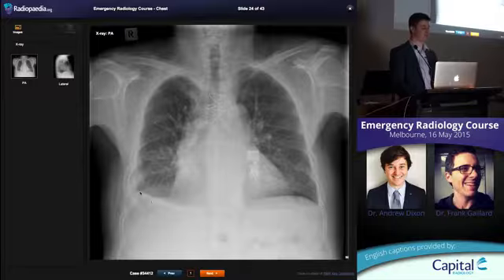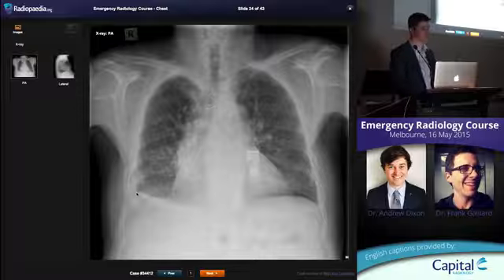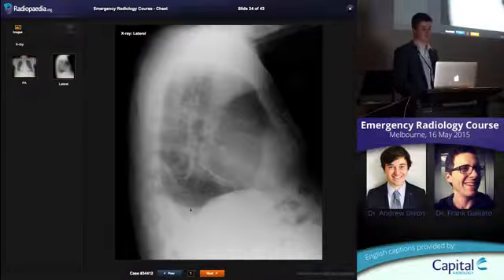If you have a lateralized peak, or the peak is right off to the side, that's a sign of a subpulmonic effusion. So the effusion is sitting down, trapped below the lung a little bit, and it creates that lateralization, loss of the costophrenic recess. So subpulmonic effusion, that's just a variant, the way that it can appear in some people. Lateral image, beautiful meniscus. There's probably pleural fluid on both sides in this patient.